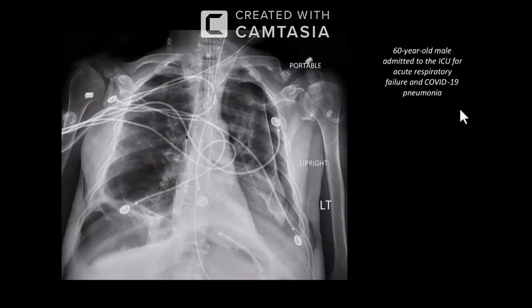And the central line, yes, there is a left-sided SVC, and the central line is not going beyond the right atrium. And we can actually appreciate an abnormal opacity with haustrations. So this is a Chilaiditi kind of pattern where a large bowel loop is going above the liver surface.